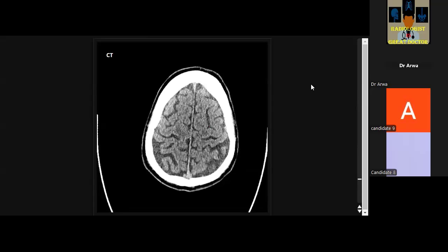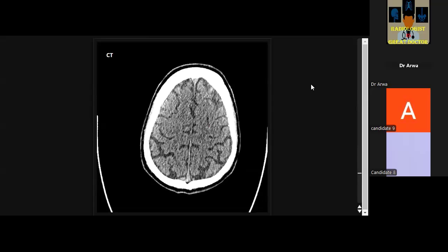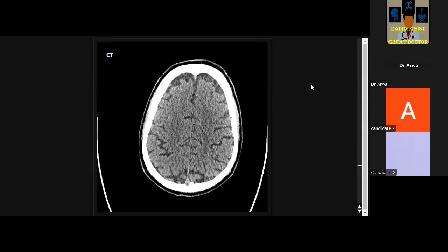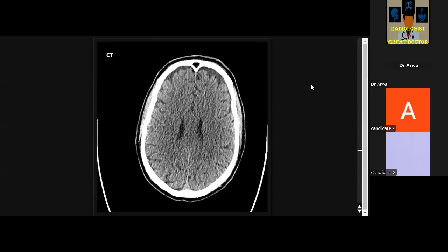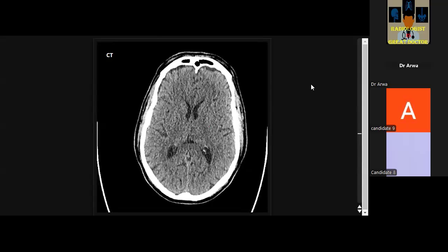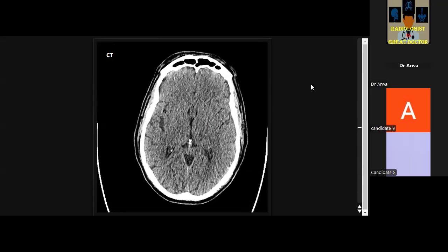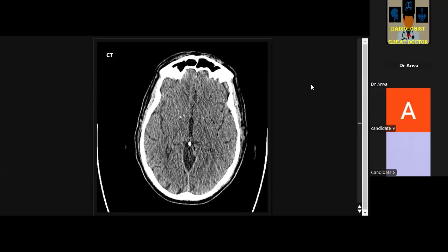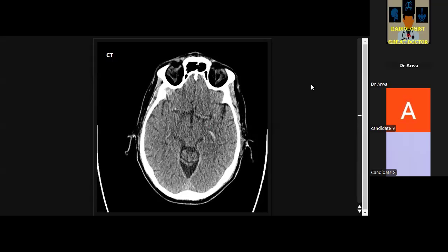As the patient is found unconscious, the superior sagittal sinus appears relatively hyperdense. Just normal, okay. Any other finding? Extraventricular CSF spaces are relatively prominent in the bifrontal region, but I do not see any hyperdense area in the subdural bifrontal regions. Good.